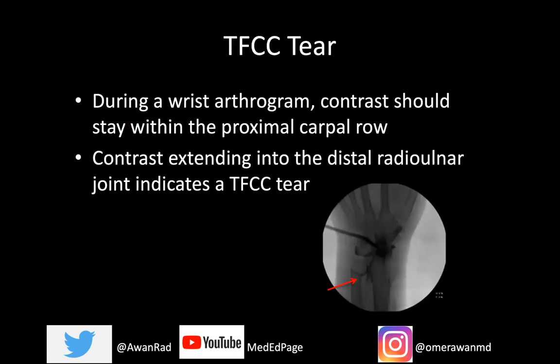Okay, so when we have contrast going in a location that it shouldn't be, that indicates that there's a tear of some sort. In this case, if you see contrast in the distal radioulnar joint, that means that there's a TFCC or a triangular fibrocartilaginous complex tear.